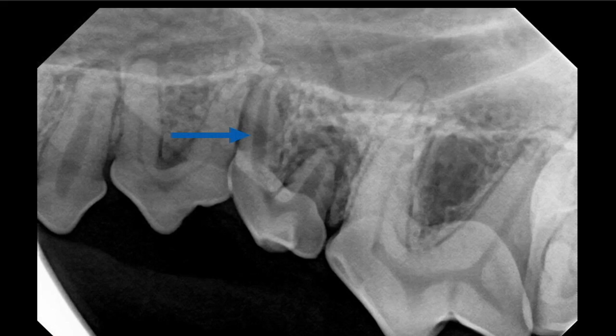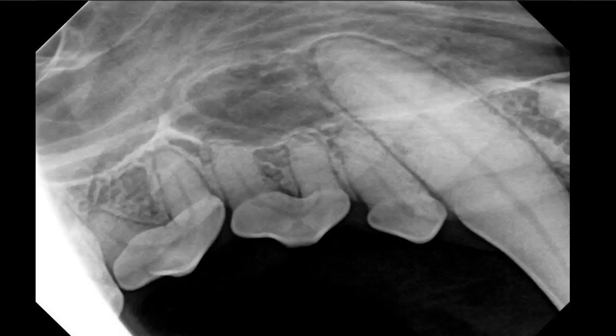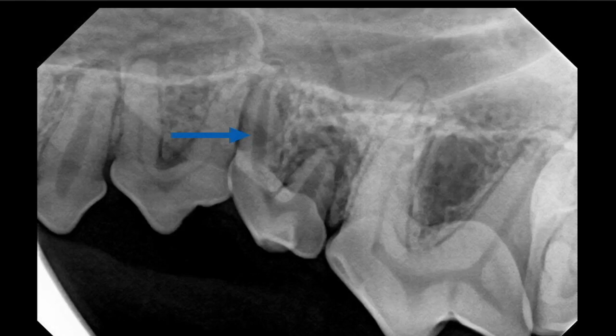The tooth has died, and the necrotic pulp has infected the bone, caused inflammation and destruction in that bone, and then that inflammation and infection gets past the bone and into the soft tissue, and that's where that lesion came from. Look at the other side to compare and see that that's perfectly normal versus this side where you've got all those changes.